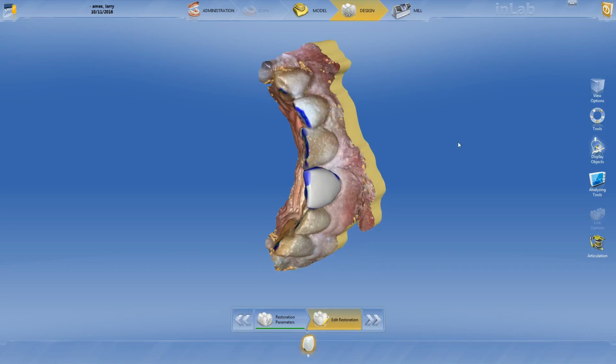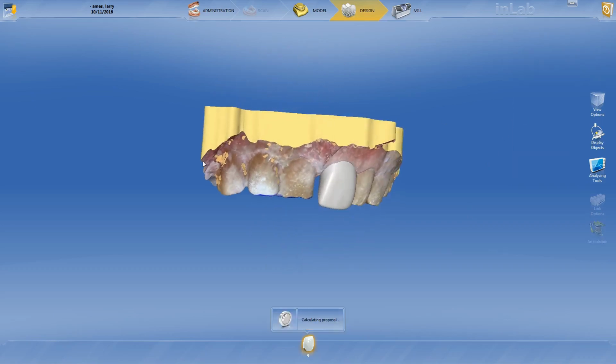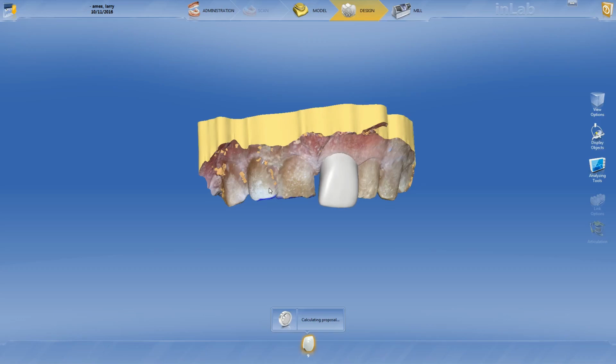In my experience, with the InLab 18, you get what you guys know as the biojaw. But in our software, it's positioning morphology phases, and I think that's in the new Sirona software as well. But let's go ahead and dive into this, and now you guys know why I am using this older software.